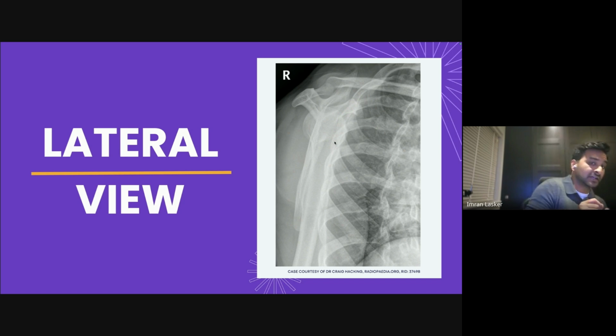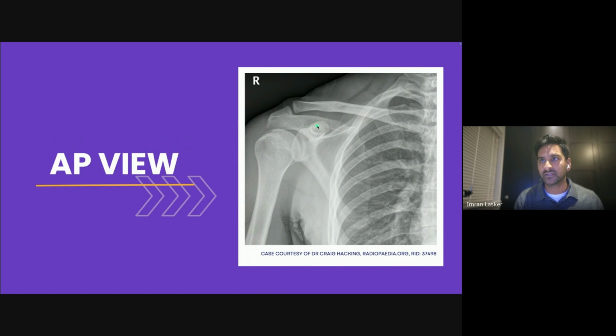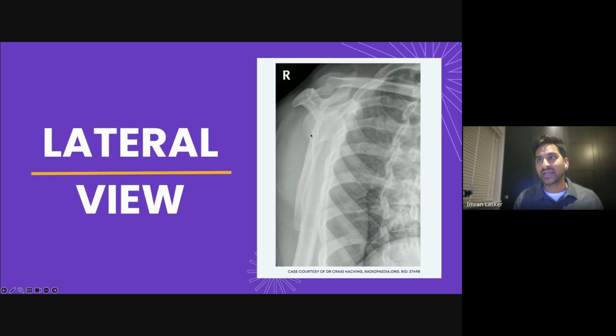So sometimes having a slight angle on things can be very useful for looking at rib fractures. And again, you've got your clavicle, you've got your acromioclavicular joint. And if you're worried about which one's anterior and posterior shoulder, there's something called the coracoid process, which I showed you earlier, which is this guy here that attaches to the clavicle with some ligaments. That's going to be the most anterior part of the body, and it looks like a little ball, whereas this looks like a bit of a flat T over here. So this is going to be the most anterior aspect of the shoulder.